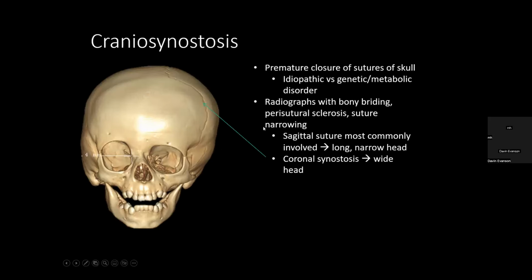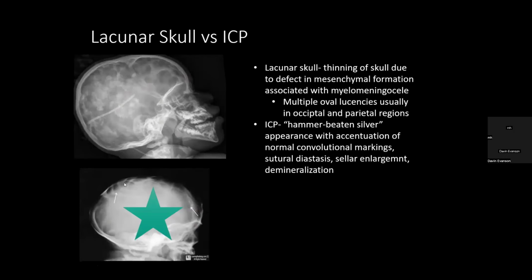So some skull anomalies, so it can do some great 3D rendering to help the plastic surgeons get a great view of what's going on with the skull. The lacunar skull, the hammer-beaten silver appearance.